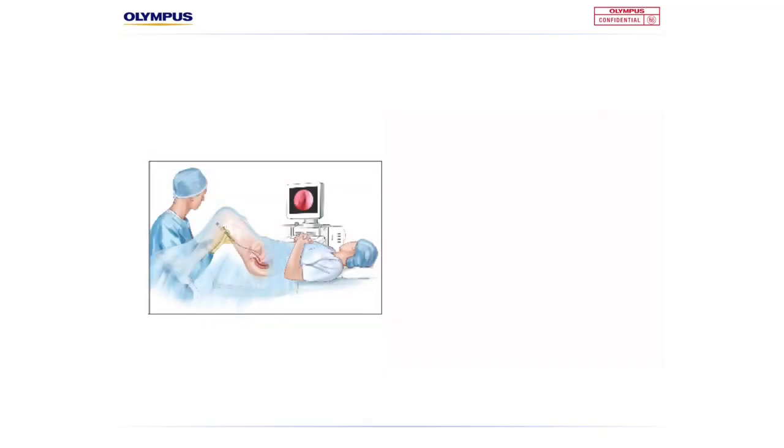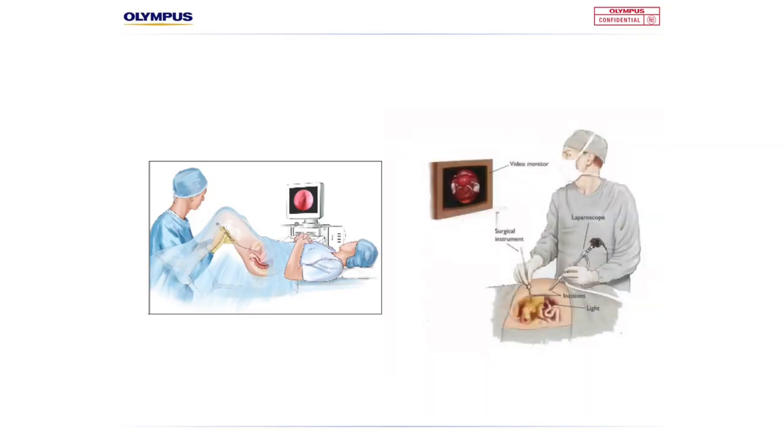Although surgical telescopes come in a wide variety of shapes and sizes depending on their application, the basic principle is the same: to gain visibility through a cavity in the least invasive manner possible. In surgery, that's through either a naturally existing orifice, such as the nose, airways, or looking into the bladder via the urethra, or this can be done through a small incision, such as into the abdomen in laparoscopy.